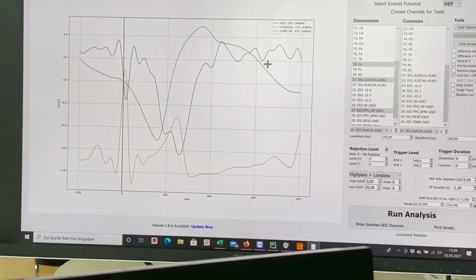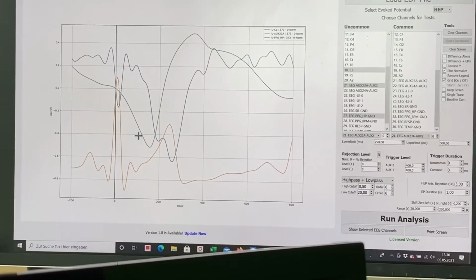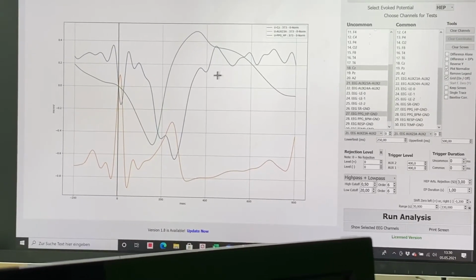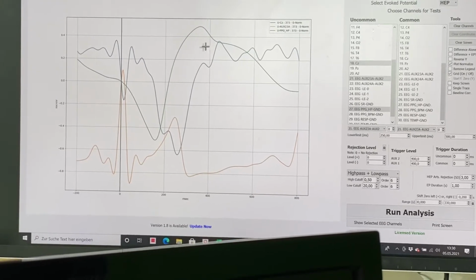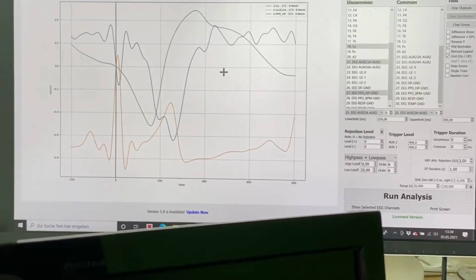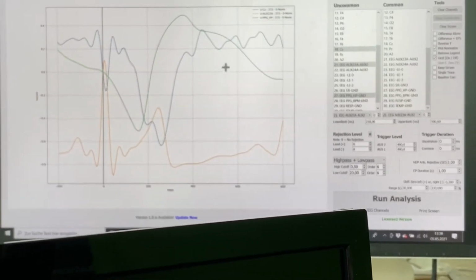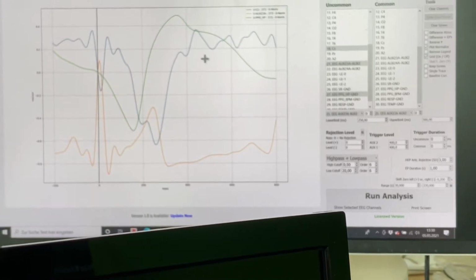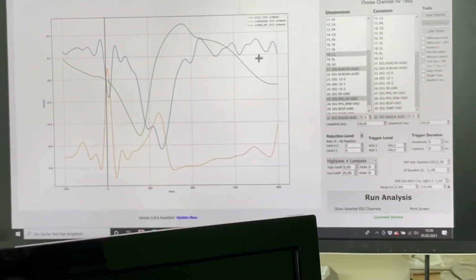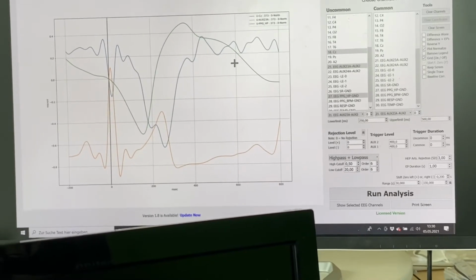this might be between the end of the systole, which is arriving at the brain, that there is a real electrical signal. In this case it's above zero. The zero line is this one, which says this is the EEG, which is correlating to the heartbeat.